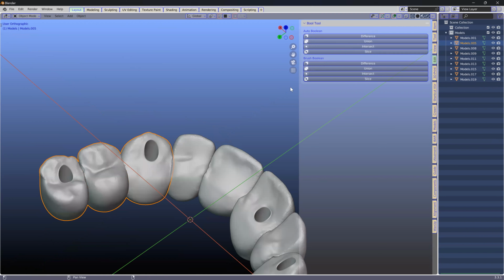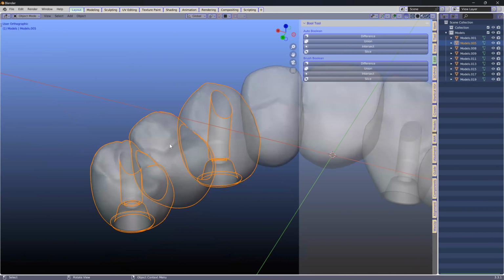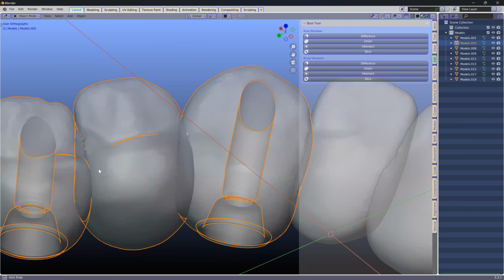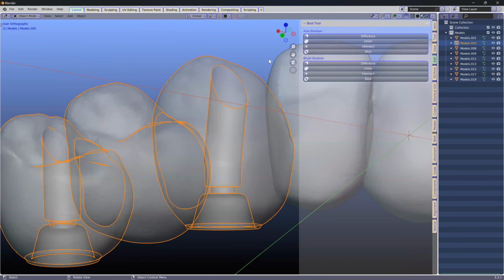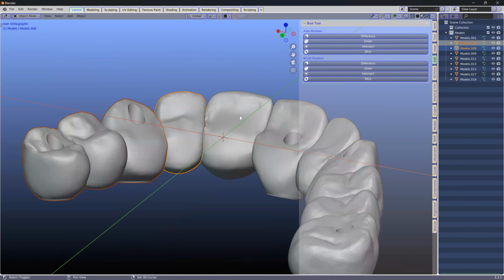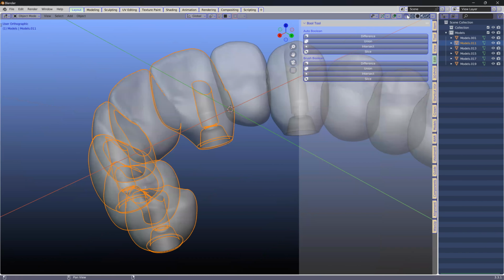I can tell if it worked if I go into transparent mode. This is the transparent mode icon. If I look at it, I can see the mesh structure. I can see these holes; they join. Can you see? Okay. So basically, what I want to do is join. I won't take all of them because I don't want anything to go wrong. So this one is fine. Okay, it's joined up. Yeah, perfect.